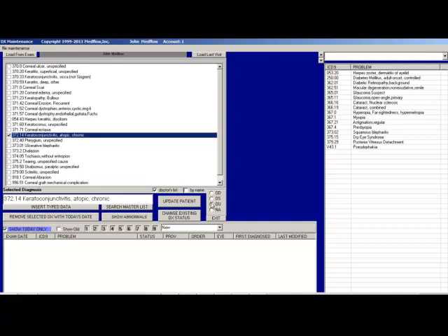You will choose which eye, the status of that diagnosis, and then you would insert the type data. When selecting Insert Type Data, you will notice the diagnoses populating at the bottom of the screen. If you wish to choose a diagnosis on the right-hand side of the screen, you would double-click on the diagnoses, choose which eye, manage your status, and then insert the type data.